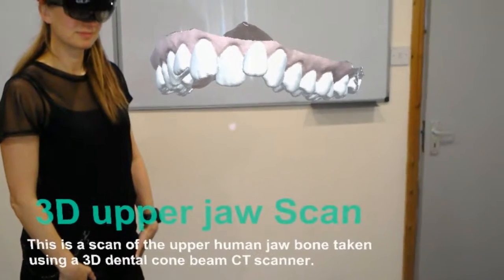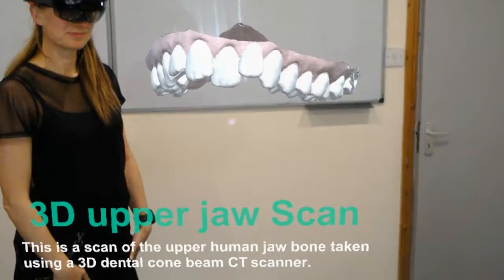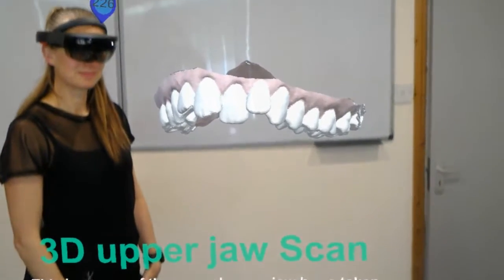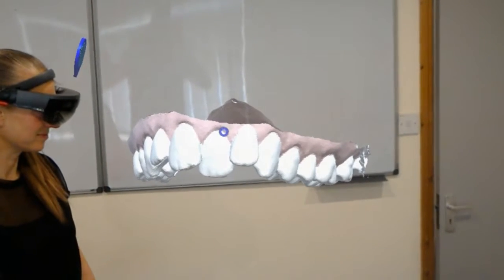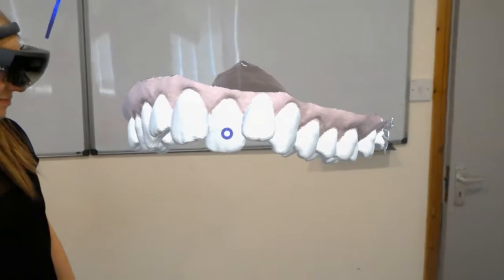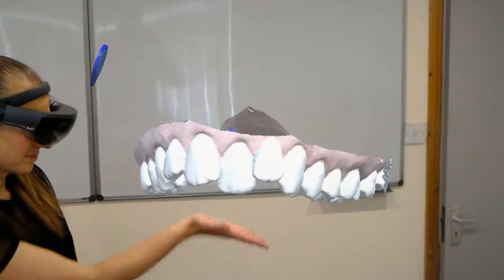This is a demonstration of a 3D upper jaw scan using a dental cone beam scanner. Lynn and I are sharing the model together, so we are both looking at the same teeth. Lynn, could you just show me where the two front teeth are from your perspective, please?